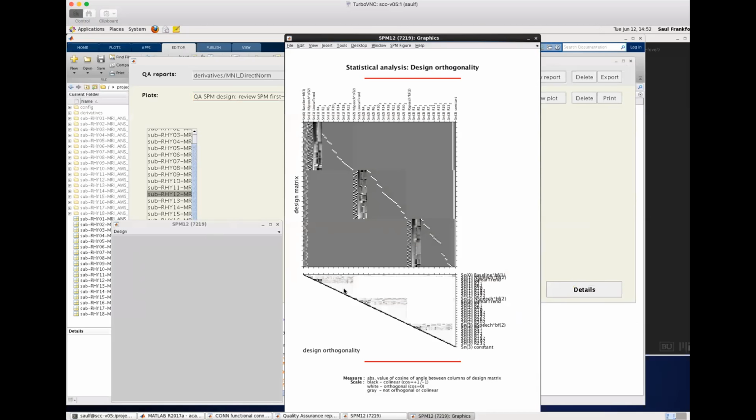So I'll try to see if I can generate some additional quality assurance plots that allow you to look at these task-related motion effects in more detail. This would help evaluate subjects that have huge motion and very few data points, where you want to know whether you can live with those because they are just noisy data, or whether you should get rid of them because, in addition to noisy data, they are going to give you biased estimates. To some extent, you can look at that in the speech minus baseline plot.